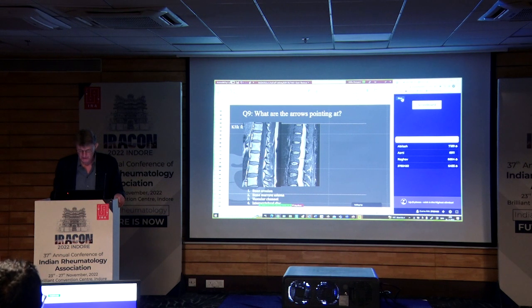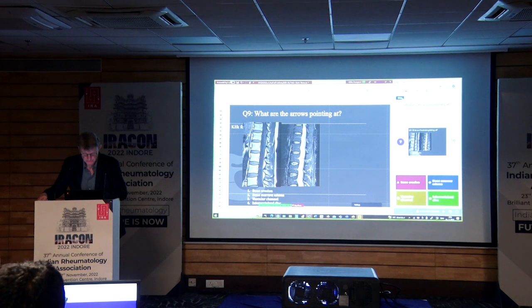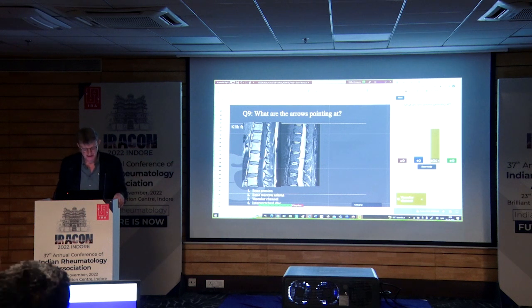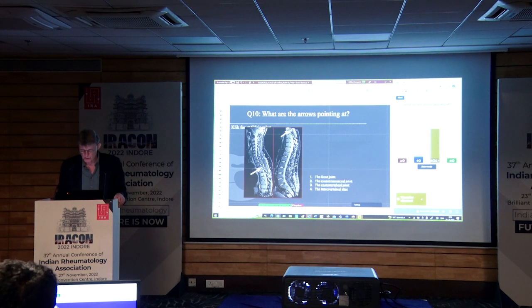So now this one. This one I actually haven't told you what this is. So now it's at least a time point where I tell you. Five seconds, 2 seconds. Great. Right. That you knew, I can see. Good. Yeah, because at the back side there is a vessel that goes in, and that may be a small one like this, or you may not see it, or maybe a bright signal going as far in as that. And that is perfectly normal, and yes, so that's good. So what are the arrows pointing at?